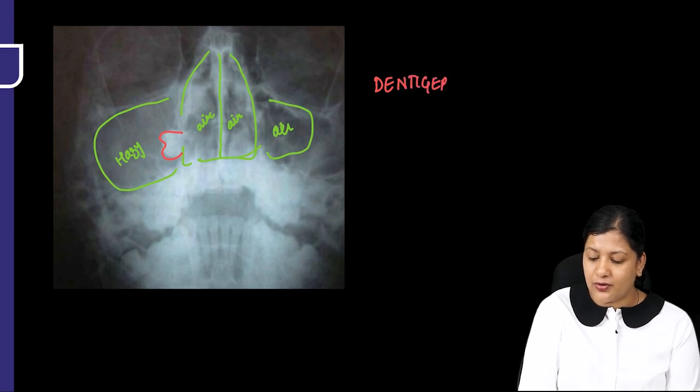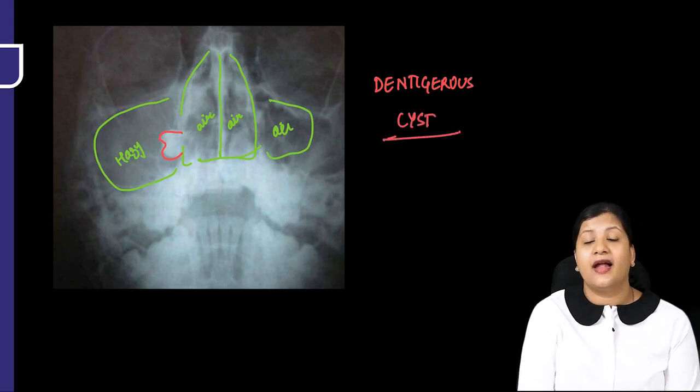So you should think about what? A dentigerous cyst. So you have the cyst that has got impacted into the lateral wall of the sinus, and from there is a cystic transformation. The presence of a tooth with haziness should prompt you to a dentigerous cyst.